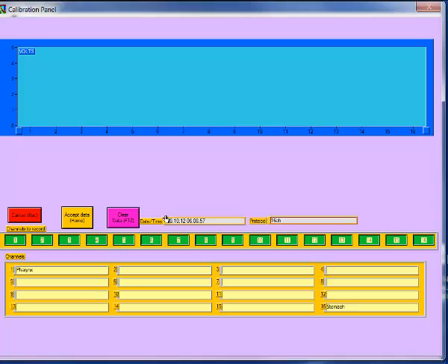The date and time control indicates the current date and time, and the protocol control is the name of the calibration protocol, which would not normally need to be changed. Clicking on Clear Data clears all of these controls, but would rarely be used. Once you have checked the information below, click on the flashing Accept Data button to proceed. To exit, click on the Cancel button at any time.